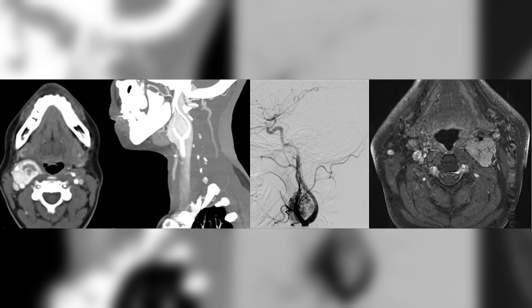In summary, the carotid body tumor is a hypervascular paraganglioma that originates from paraganglionic cells at the carotid bifurcation. It typically appears as a well-defined mass that strongly enhances after contrast administration and causes splaying of the internal and external carotid arteries. On MRI, the presence of multiple flow voids gives the classical salt and pepper appearance. Beyond diagnosis, imaging plays a critical role in surgical planning. These tumors may range from small, localized lesions to large masses encasing the carotid arteries. Therefore, radiological assessment is not only diagnostic, but also predictive of surgical difficulty and potential complications.